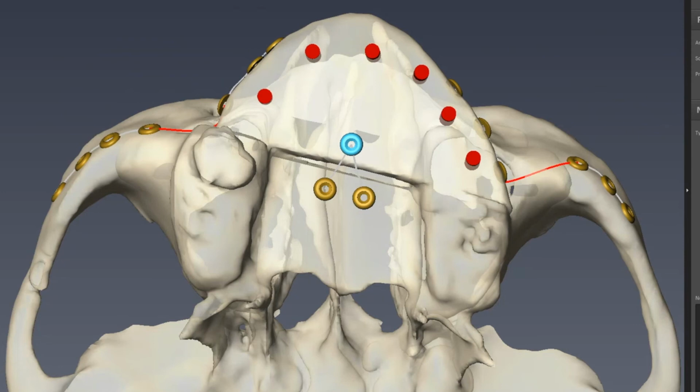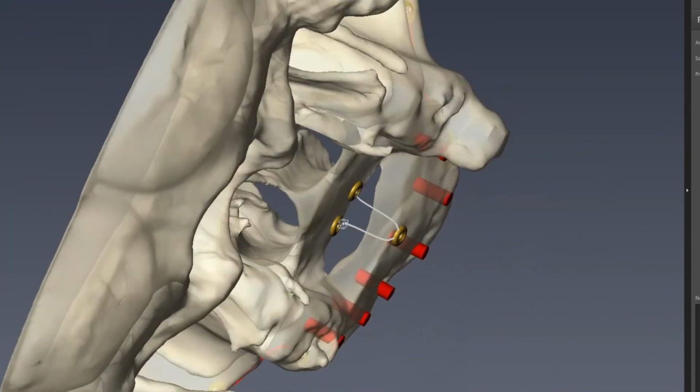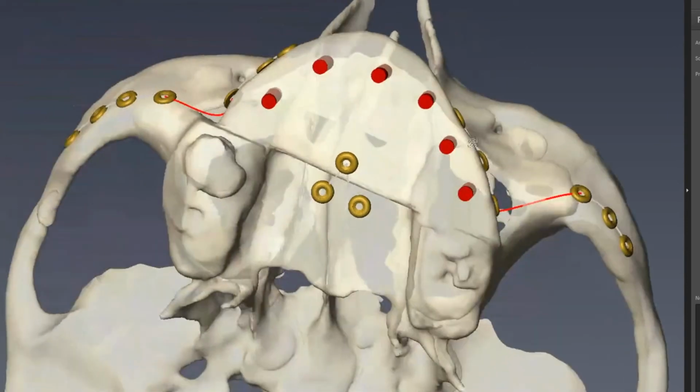Okay. Yep. So with the 1.7, we can do 0.8, 1.0, 1.2. I think it's not gonna be very thick bone, so maybe the lowest, the 0.8 profile. Yeah, that'll be fine. Okay. And then this is the shape of the plate here. So it's contacting the native and then jumps down to the scapula. That's fine, because that will be covered up by soft tissue, so it shouldn't be an issue.